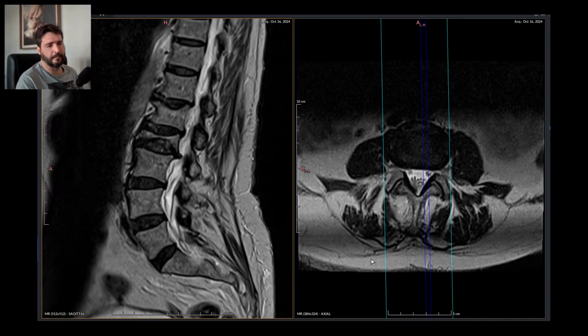So how are we doing? We are 1 hour 20 minutes in. So let's grab a final exam. I have here an arterial brain angiogram, an MRI angiogram of the brain. This should be fun. Let's download and see why they ordered this exam.